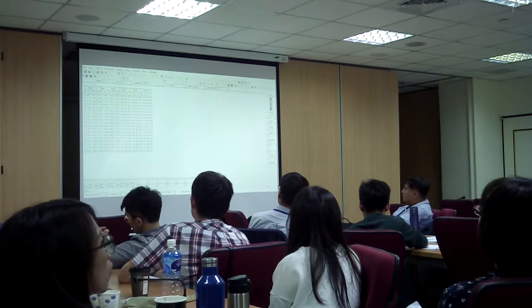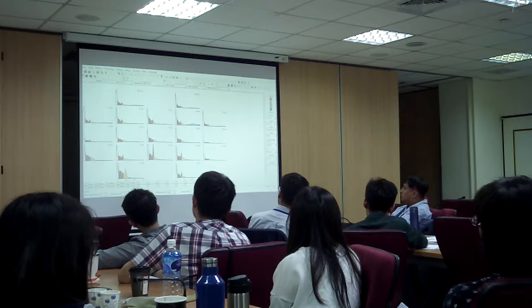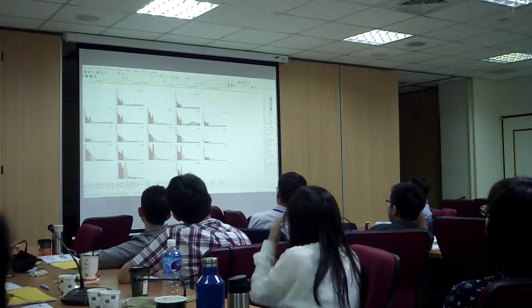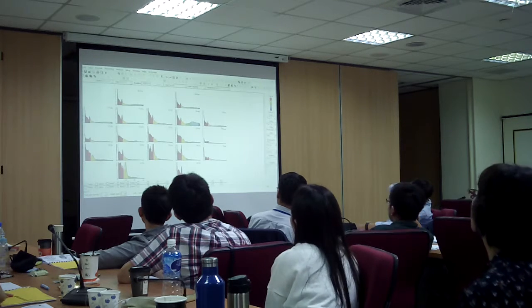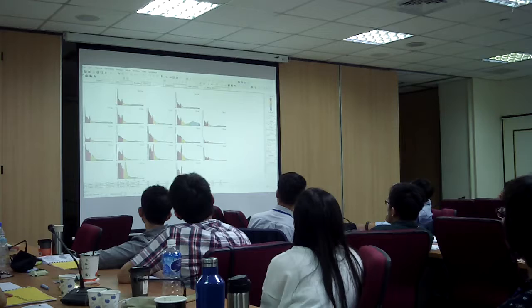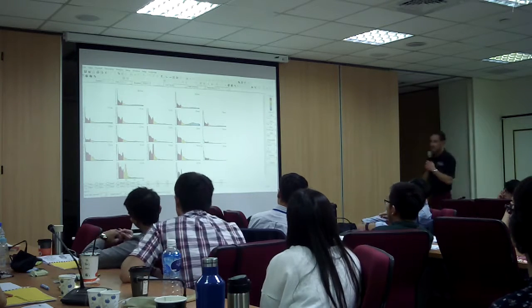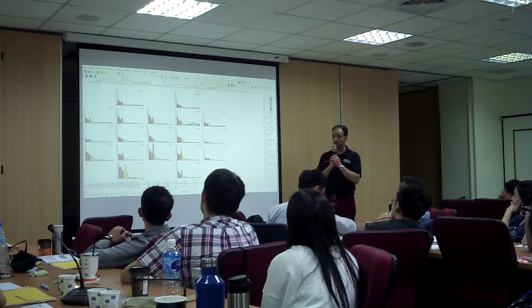And you're going to tell me, please, what you would train and where you would train it. So there it is. This right here is EMG, this is EMG, this is EMG, because I did not edit it out, so don't worry about that. That's EMG. So again, the question is, where would you train? What would you suppress? Where would you reward, and why?